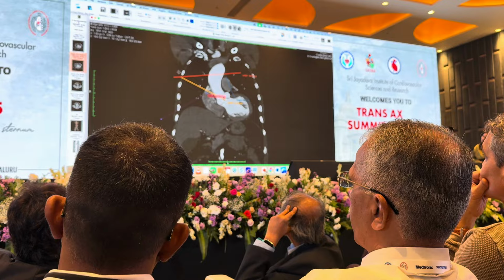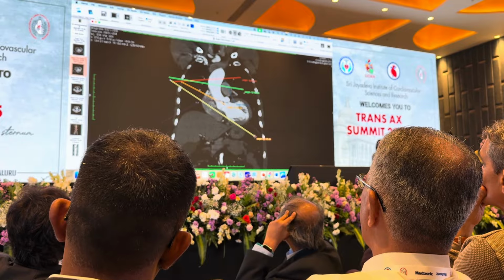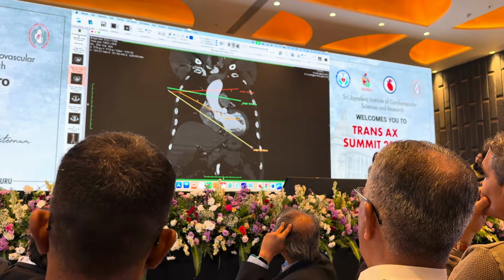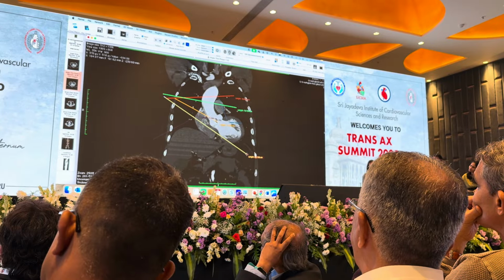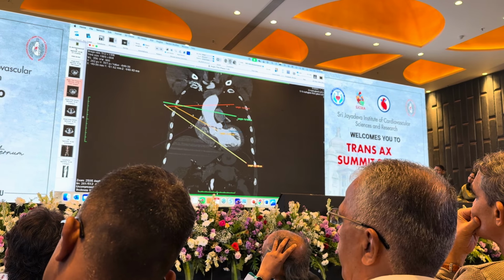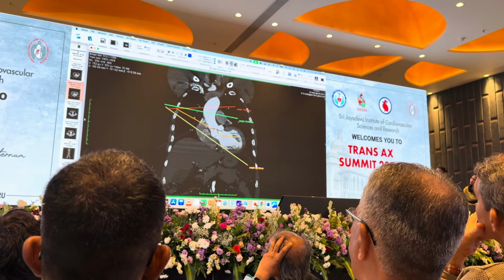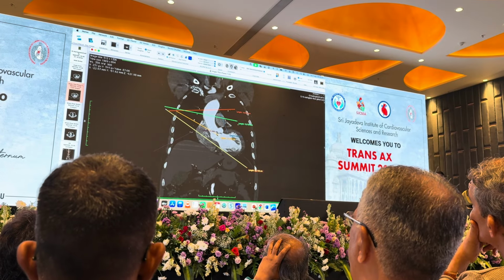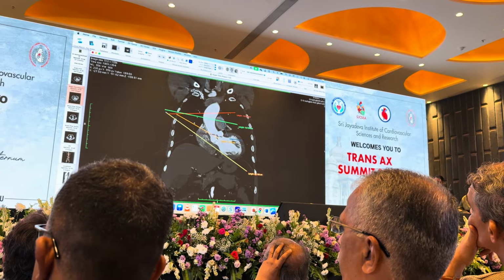So what you see here is that you will have this kind of view. You will see the clamp won't be on the line. You understand that your aorta will be sufficiently long to work inside it. You can anticipate that your right atrium, you can put it out of the way. Also, you get other information. Another thing I think is important: when you look at the CT scan and you're considering entering this intercostal space, what you want to see when you open the chest and when you open the pericardium is this part of the aorta and the tip of the right atrium. If that part is in front of the intercostal space, that is going to be 99% the right intercostal space.